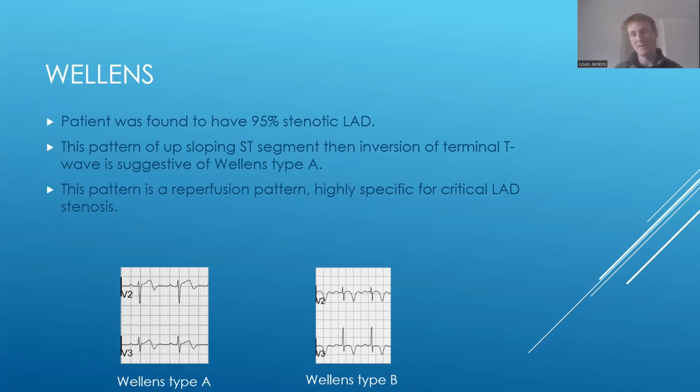This is imminently going to be occluded, and this patient should go to a cath lab. And you could take them under high risk ACS if they still had any persistent symptoms of ACS. Okay. So under them having inverted T waves in 2 or more leads. So again, if you see this pattern, really dig for those, hey, do you still have any chest pain? Are there reasons that I can take you under that high risk ACS pathway? Because these are patients that are going to occlude imminently.